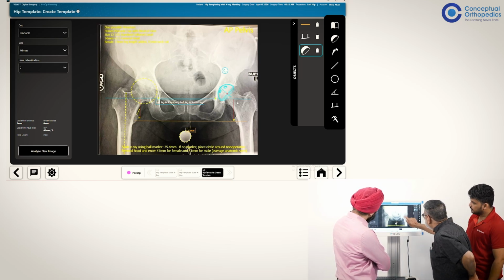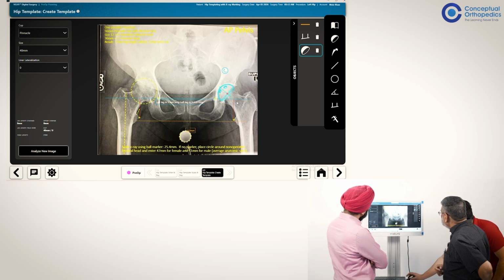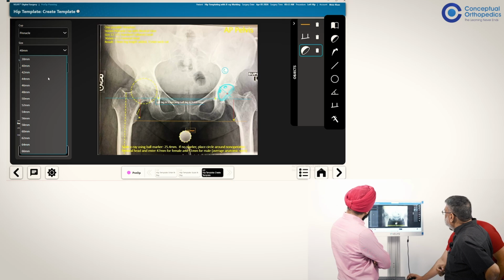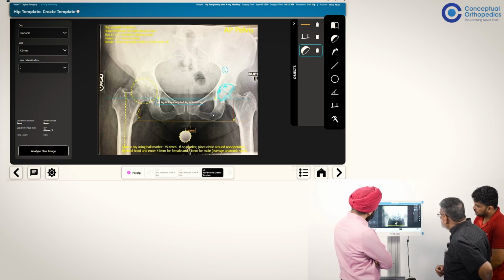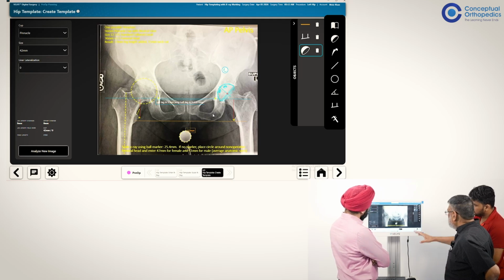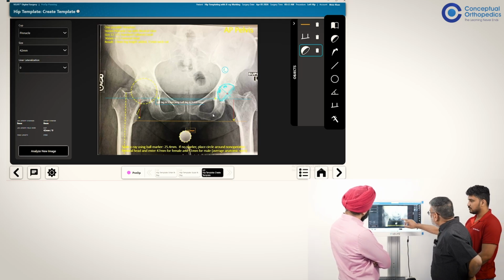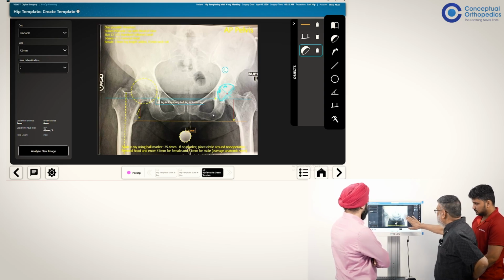You can get slightly even out of this margin. Yes. Yeah, because I said you can, let's try 42. And for me, that's probably a better fit. Yeah, so we got the inclination, we got the height, we got the medial lateral. So that's the cup decided there. And we're not rotating it, that's the cup.